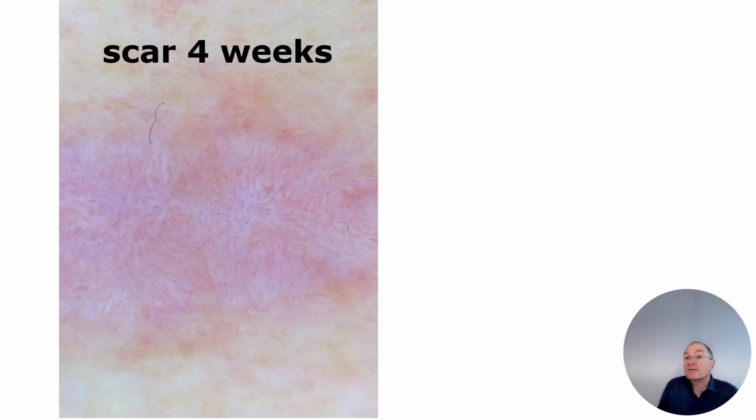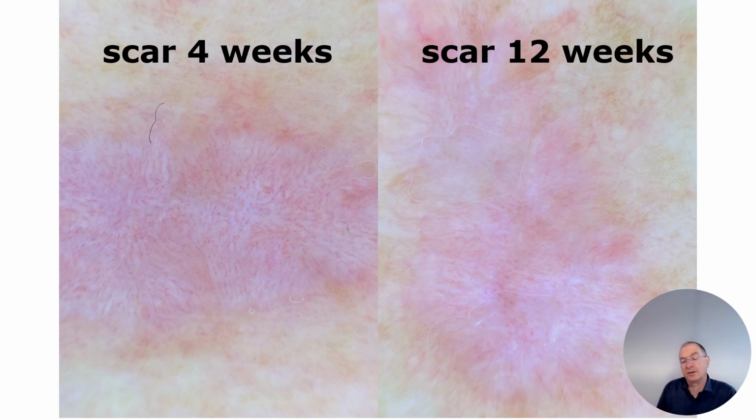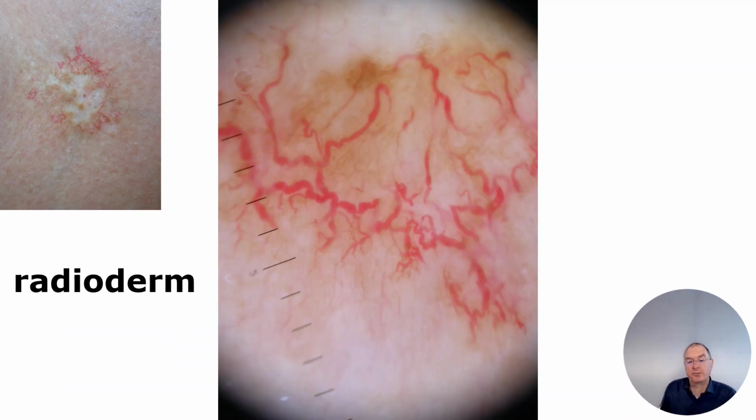Correct. Also, we need to know a little bit about the vessels of the scar. When the scar is, for example, horizontal, then the vessels are going vertical, so just 90 degrees around. And after a while the scars are going to disappear. They are going to be less pronounced after some weeks or months, so this is normal. We need to deal with different situations.